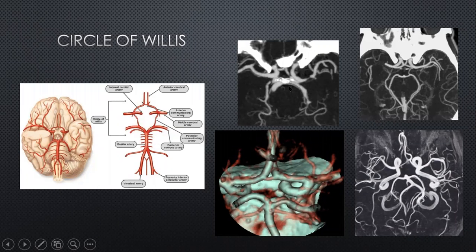And this is a picture of the CTA angiogram to show you. So this is the carotid artery here coming here, just medial to the clinoid process, moving laterally the MCA. Similarly, this is on the left side. You can just about see the ACA. This is stenotic, but left MCA. And you don't really see the circle of Willis completely because it's such a thick slice.